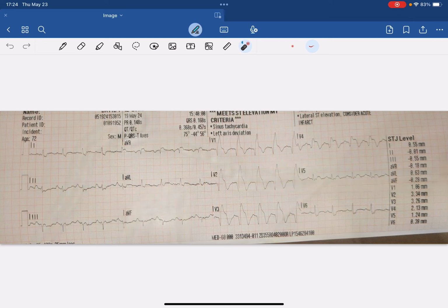Now, in this particular case, that was not the case. This man was having a full-blown acute coronary syndrome. And the reason why we're using this ECG as a teaching example is because it offers some good examples of what to do if you're ever confronted with this situation, and maybe the symptoms are a bit ambiguous, or maybe the interpretation by yourself and by the monitor is ambiguous.